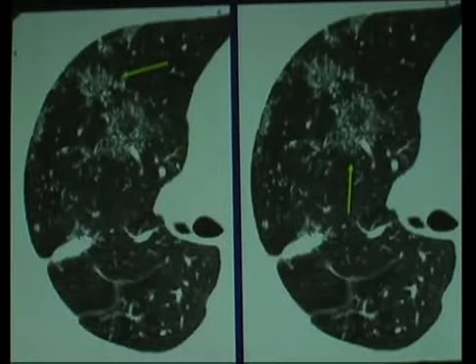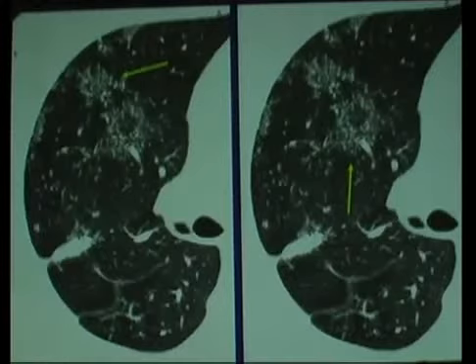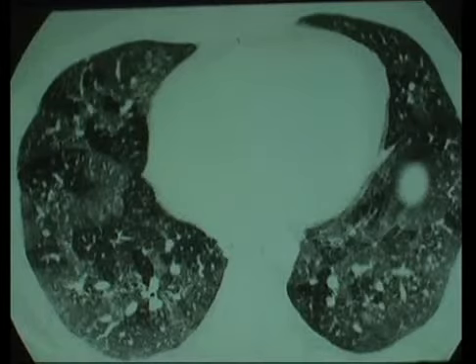Alveolar sarcoid, what's that? Well, if you can imagine a cluster of these small things, again, a typical distribution, but you can imagine these things clustering to the extent that on a chest radiograph, they're going to look like vague areas of nodularity. You may even see air bronchograms in there. It's classic for what an alveolar sarcoid pattern is, but if you look at it in cross-section, it really doesn't have anything striking about it except for this clustering effect, which we've already seen. Really diffuse. So someone will look at this and say, ground glass attenuation. It's really not ground glass attenuation if you look carefully.